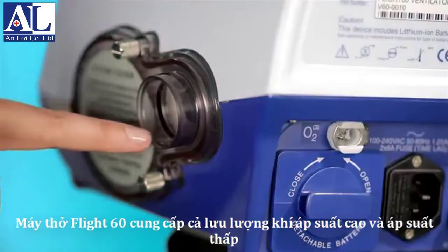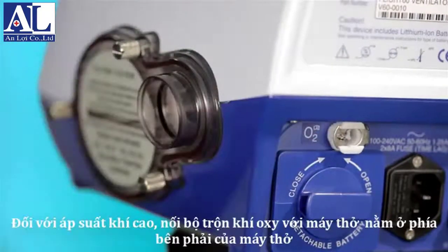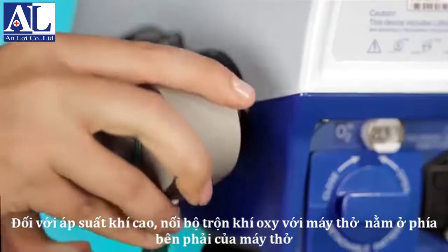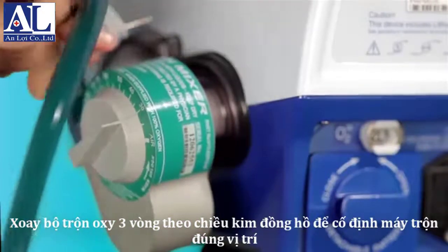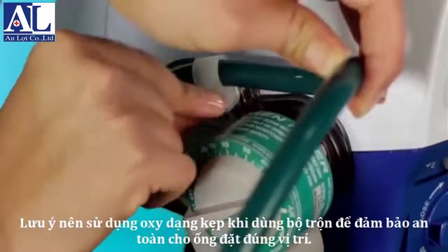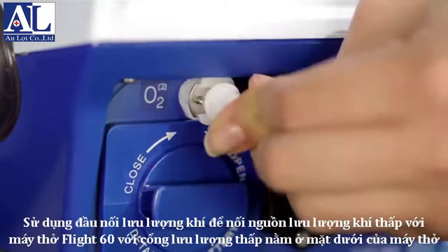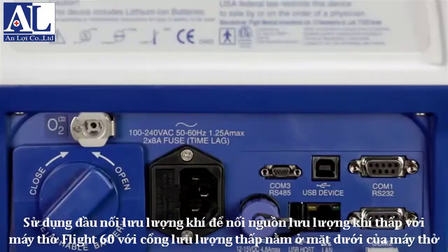The Flight 60 provides both high-pressure and low-flow oxygen options. For high-pressure oxygen, connect the air-oxygen mixer by inserting it into the fresh gas intake located on the right-hand side panel. Rotate the mixer 3/4 of a turn clockwise to secure the mixer in place. It is recommended to use the oxygen tube clamp while using the mixer in order to secure the tube in place. Use the low-flow connector to connect a low-flow oxygen source to the Flight 60's built-in low-flow port, which is located on the back panel.